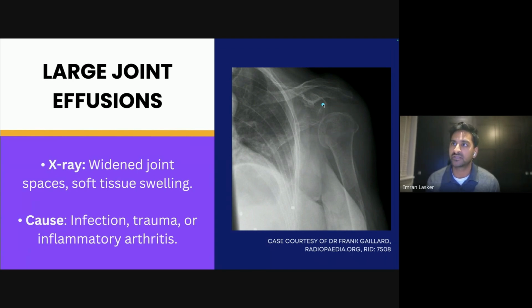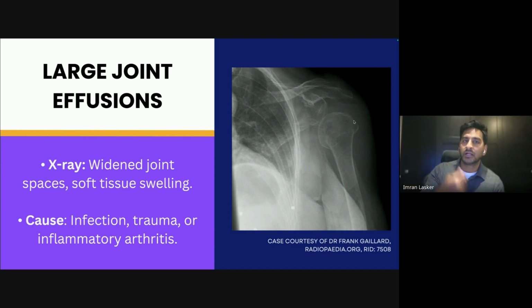But one of the things you may notice is that you've got your glenohumeral joint over here, but this is all the way over here. So this could be an anterior dislocation. But sometimes the trauma is quite bad and you've actually got a bit of fluid that builds up over here and then pushes everything down. Now, the reason why I think this is more likely to be a joint effusion rather than anything else is because in the human body, you should not have straight lines at any point, right? But when you look at this, it has a straight line that goes all the way across. So that must mean it's a fluid level, right? And that can happen because there's blood or fat or fluid. What you can see is a fluid line like so, and you've got everything being pushed down. So therefore, this must be an effusion pushing things down, making this sublux, and there's probably going to be a fracture as well.